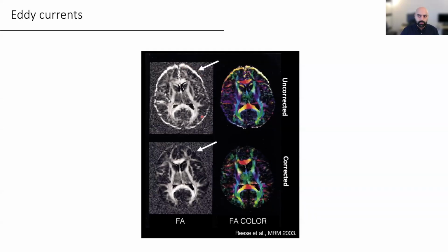But although this is a characteristic rim effect, the data is entirely affected by it. Within the brain, we see it less because it's still brain data versus brain data. It's just not the same anatomical location anymore. So it's not the same brain data, but we still have the effect everywhere in the image. So this rim is just indicative that the data hasn't been corrected properly, and it's an indication that the entire thing should be re-preprocessed.